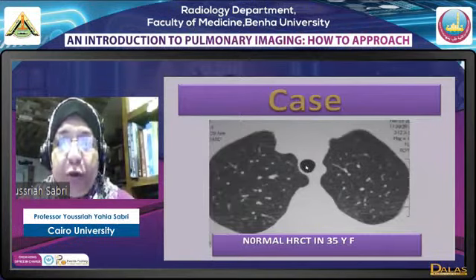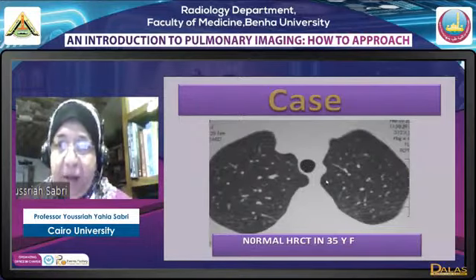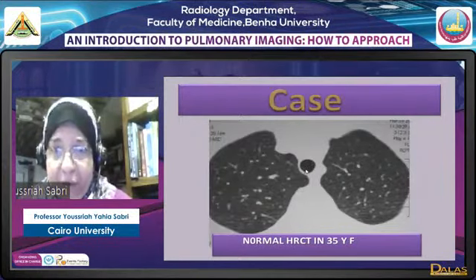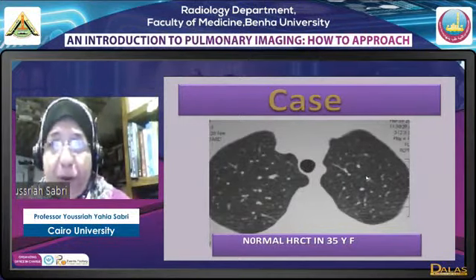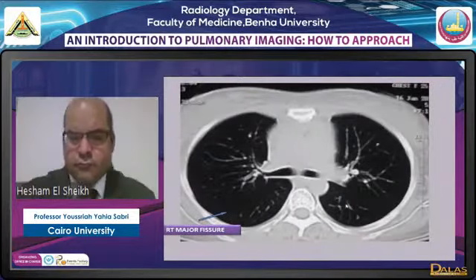الحاجة الثانية I should compare the lucency of the trachea to that of the lung. Both are black, but there is a discrepancy in the blackness. لو اللنج نفس اللوسنسي بتاع التراكيا this means I'm having a hyperlucent lung. ده في الهارزوش. طيب بعد كده الفيشرز مهم جدا، ده conventional CT study.